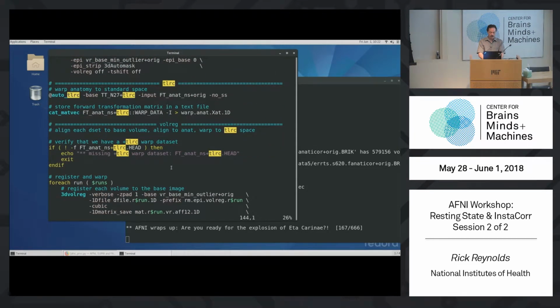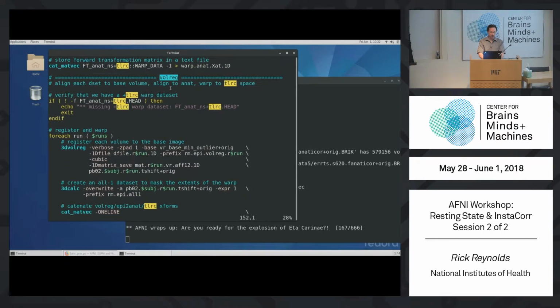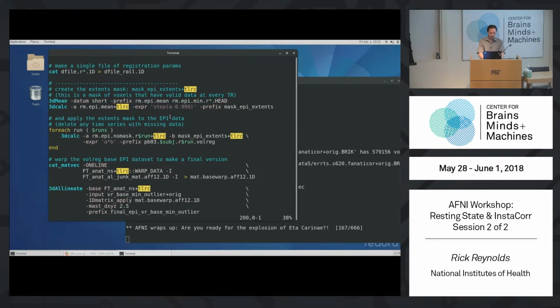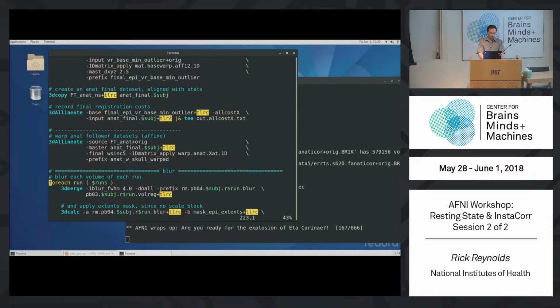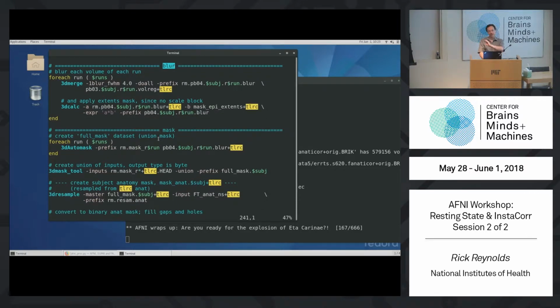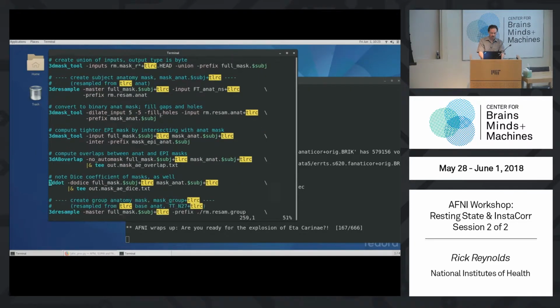It's all going to happen after the volreg block. The volreg block doesn't look special. The blur block doesn't look special. We know we want tissue-based regressors to be created from the volreg, but we haven't done that yet. afni_proc.py knows what the volreg output is called, so it hasn't worried about it.